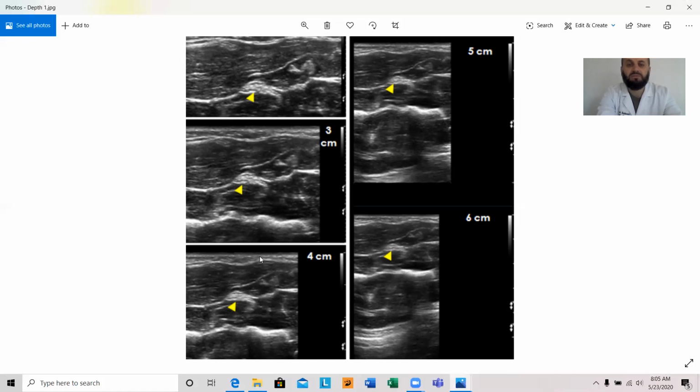It makes the machine slower. The longer the sound travels, the more energy it loses, and then coming back. So you will have a lower frame rate. You will have fewer cineback options, because when we freeze the image and want to see it, we have to cineback and choose the right image or the right frame.